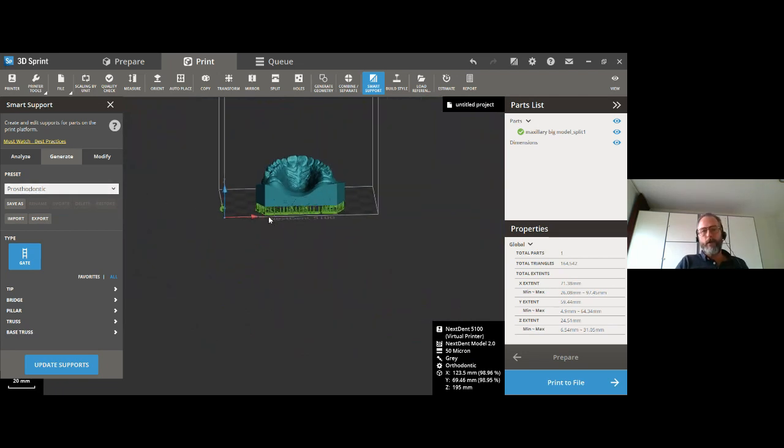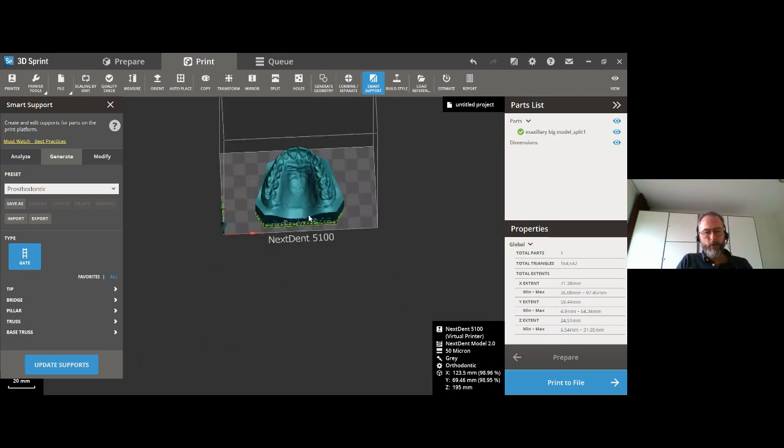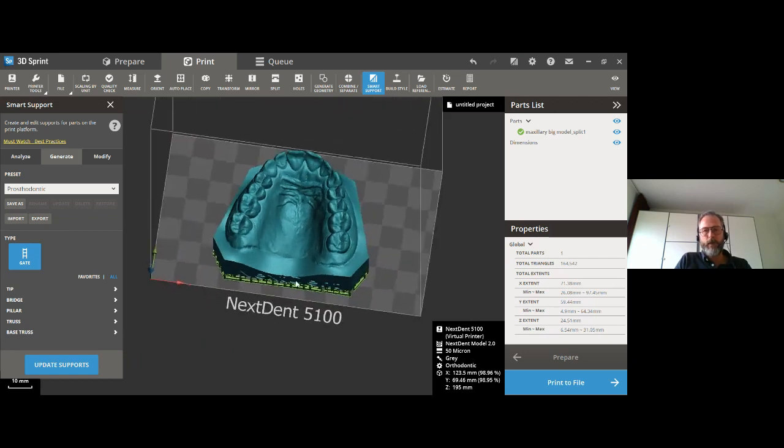We also have the same build style for premium. And if you angulate the model a little bit and you are in premium, you select the angulated build style, or support style, sorry, for this. Hope this answers your question.